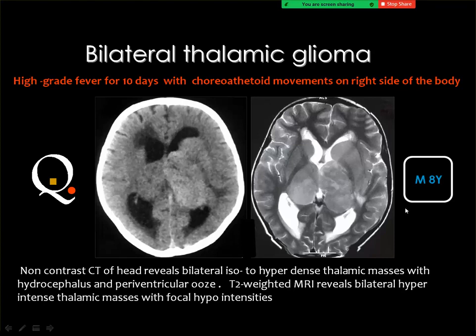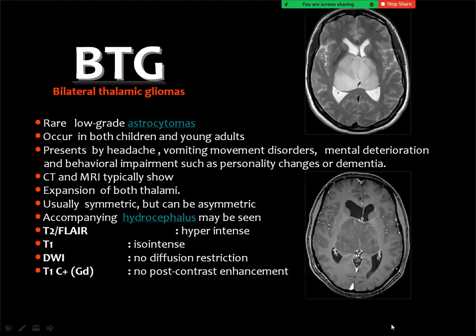The case can also fit for the diagnosis of lymphoma, but you know that lymphoma is a sizable mass with little mass effect on the adjacent structures, but this is an aggressive mass with marked mass effect on the third ventricle.